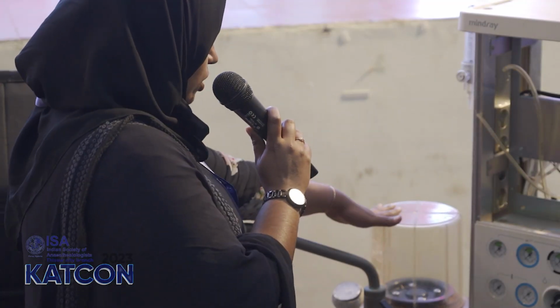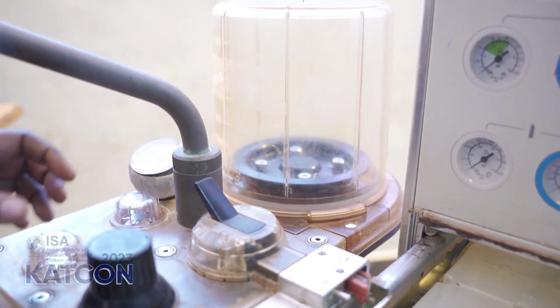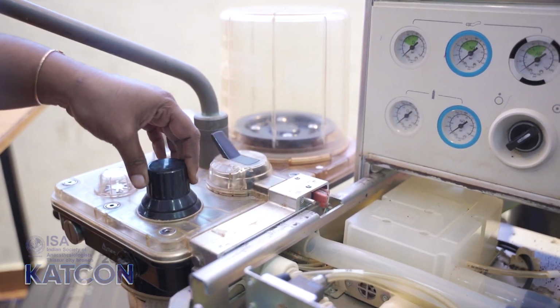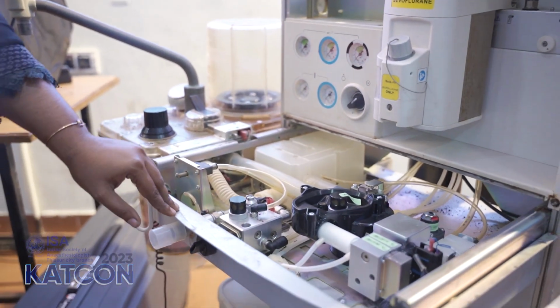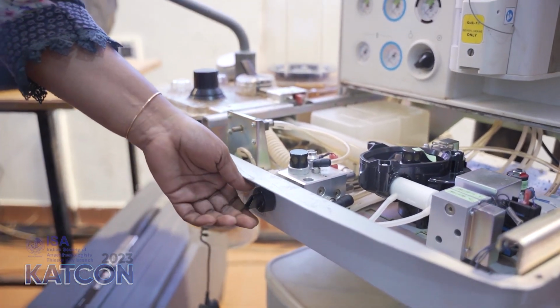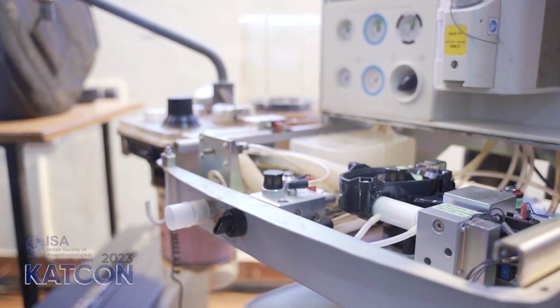Next it comes bellows. Here also one pressure gauge is there, which displays the pressure inside the circuit. Through the APL valve also we can adjust things. Then next comes the flush, which sir told about, which we use in emergency situations. And here also you should check primarily whether it is going to the ACGO or to the breathing circuit. And also here are the flow meters.